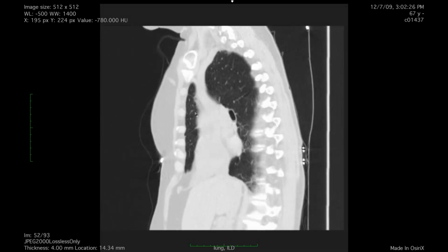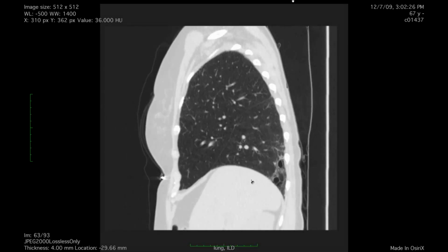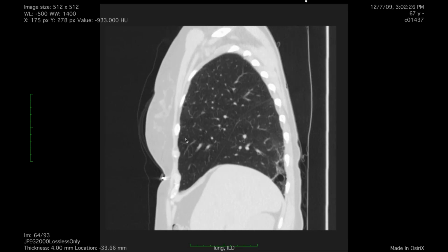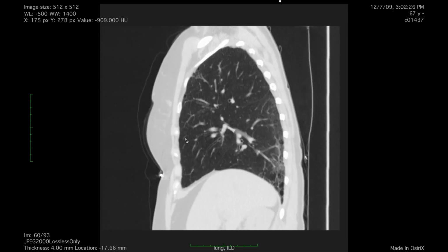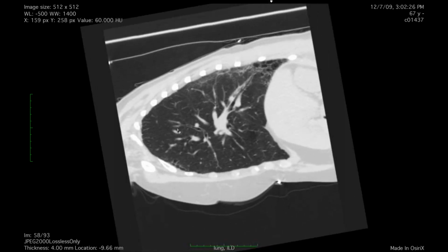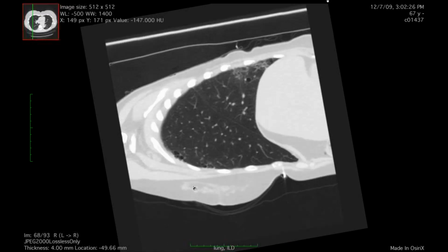I don't know. That's another question, if that could be a cause of this irregular emphysema, airspace enlargement with fibrosis. So I'll look it up. Travis, why the aspiration argument for the anterior stuff in the upper lobes? That's kind of out of the aspiration zone, isn't it? I think if people are prone. Yeah, rotate the sagittal to prone, and you can see that becomes pretty dependent. Yeah. So I don't know any adults who sleep prone. Many do.